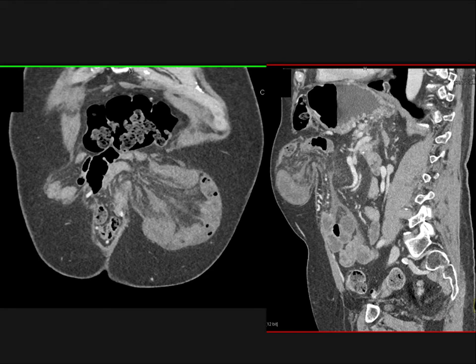And you can see from even the sagittal views, those loops look dilated, they look kind of ugly. This patient needs to go to surgery. And you can see in this case, the surgical defect, the hernia defect, was relatively small. With very large defects, you're not going to have incarcerated hernias, or you're not going to see the twisting. They'll just sit there. But here, small point, boy, you got to be really, really careful. And there's just a few more images.